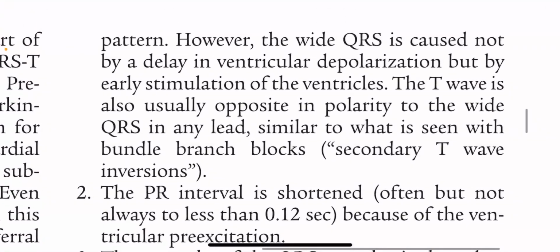However, the wide QRS is caused not by a delay in ventricular depolarization but by early stimulation of the ventricles. The T wave is also usually opposite in polarity to the wide QRS in any lead.